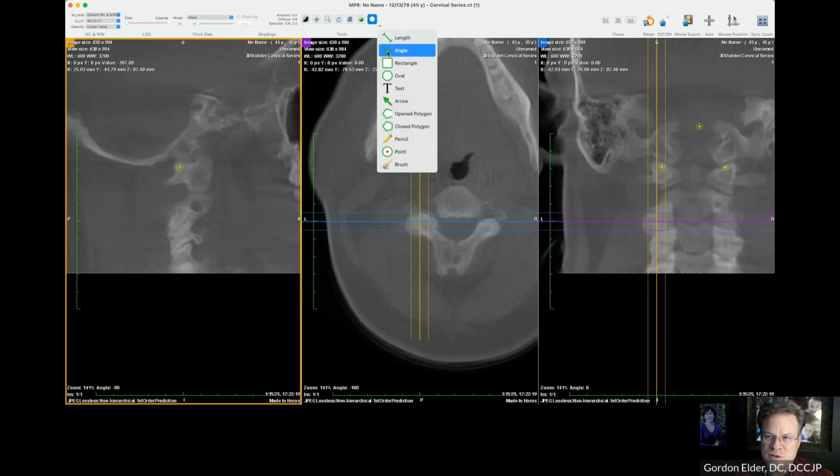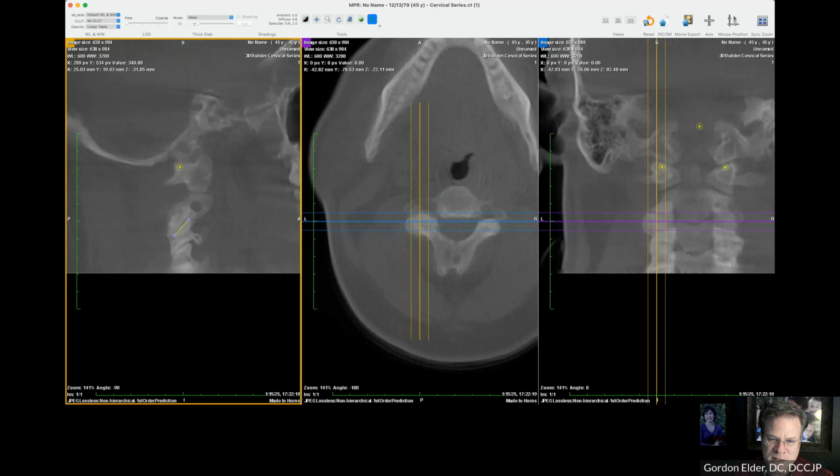So in case I do have to adjust it, I go ahead and I measure everything, even if I don't see a misalignment at that level, because who knows what's going to happen in the future, and at least we have the measurements. Okay. I just took a shortcut. I shouldn't have done that because some cone beams do not cut off level to the ground. My particular one does. Some are more in a cone shape. So really what I should be doing is lining it up with this.